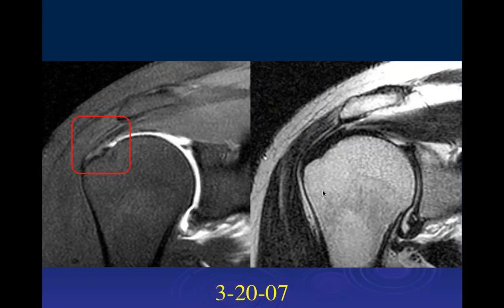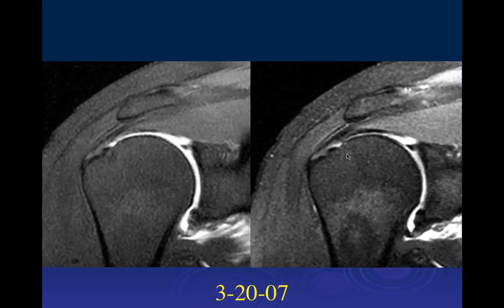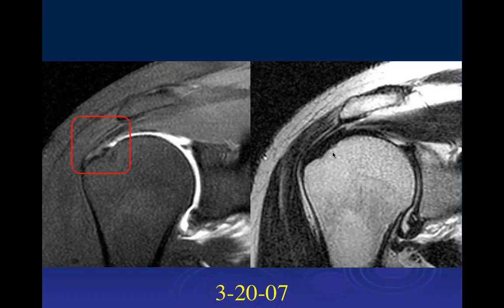Weird. Okay, so here's the T2 weighted image. What do you see with it? Okay, well, we're seeing some kind of little hypo-intense signal in that same area. On the T2, it really looks pretty dark. Yeah, it looks pretty good on the T2. So this really looks like an inferior partial tear with what really looks like maybe some fluid or contrast from the joint space extending into an inferior partial tear, but we really don't see much on the T2 weighted image itself.